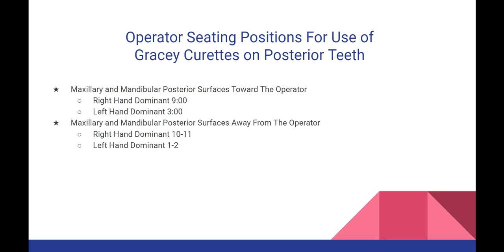Operators are allowed 1/2 hour adjustment in basic seating positions for surfaces toward them. Most right hand dominant operators will choose 8:30 for all other posterior surfaces toward them. Most left hand dominant operators will choose 3:30 for all other posterior surfaces toward them.